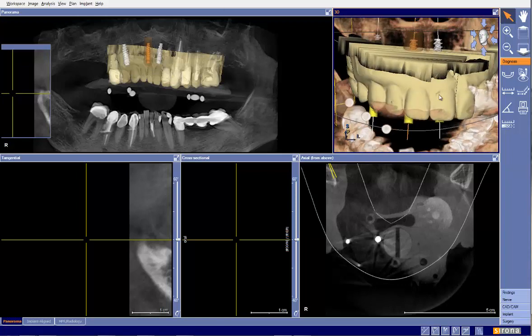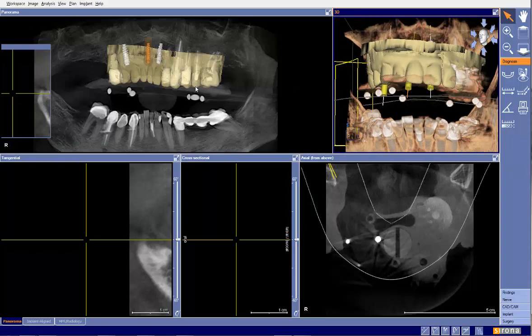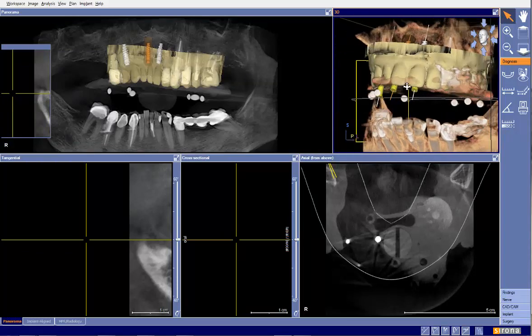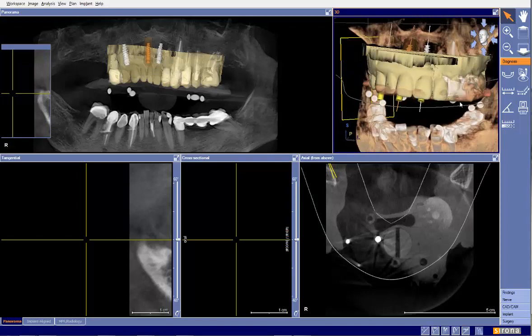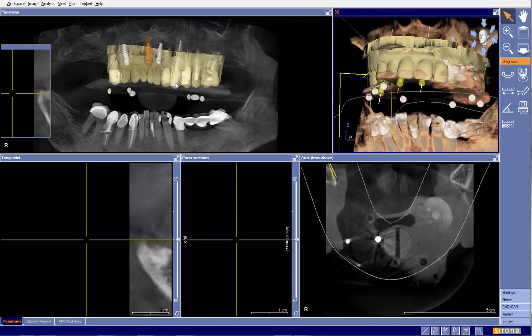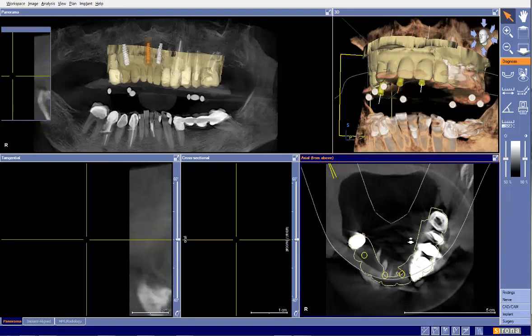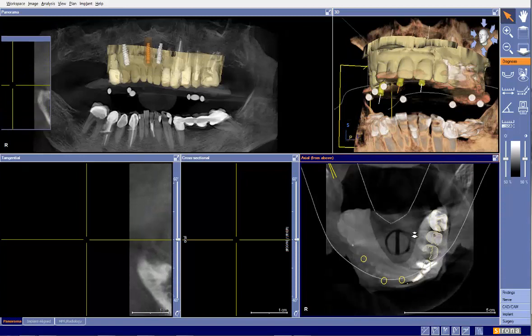So the first very positive things that were done here are a couple of different things. One, this patient was scanned with a bite plate, as you can see by here, by the fiduciary markers. And number two, we also have a full arch CEREC scan here. Looks like it was scanned with the partial in the mouth, which is fantastic to help us plan the implants. But based on the fact that the CEREC was able to integrate, and it looks quite accurate actually, we could technically have this fabricated as an OptiGuide.